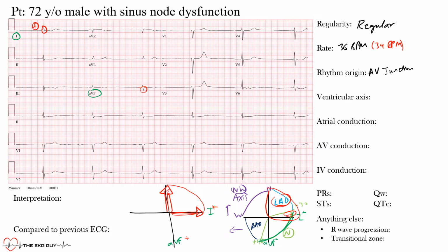Well, what's nice is that we have a lead here called lead 2, that sits at +60 degrees, and actually perpendicular to that lead is a lead that comes this way here, and that comes at -30 degrees, as you can see, just like this one.